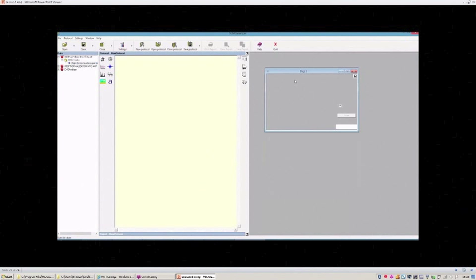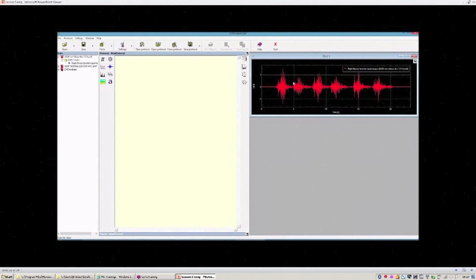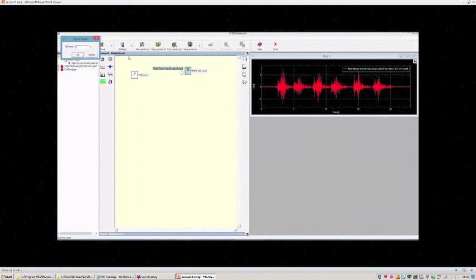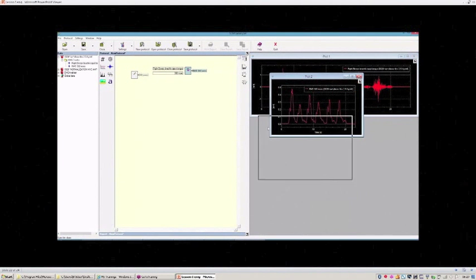This is the signal that we want to normalize. The first thing again is to compute the root mean square, so to compute the envelope with the same algorithm. Also in this case I'm going to choose a time window of 300 milliseconds, so we have to define the time window input. Okay, and now I can show you the results.